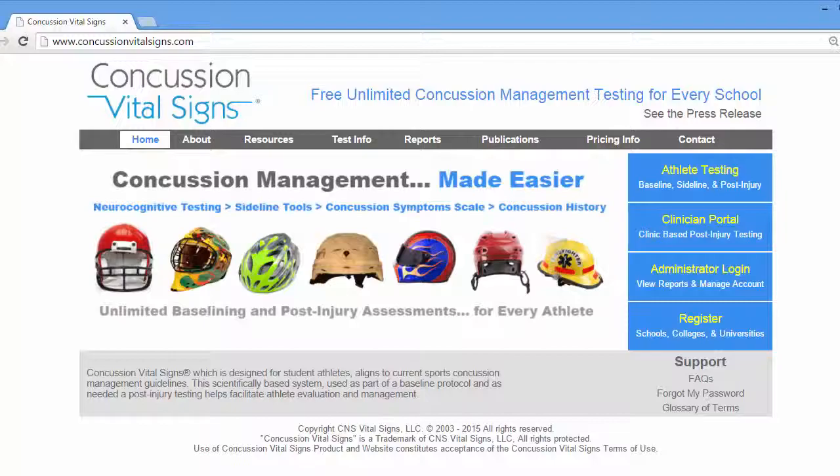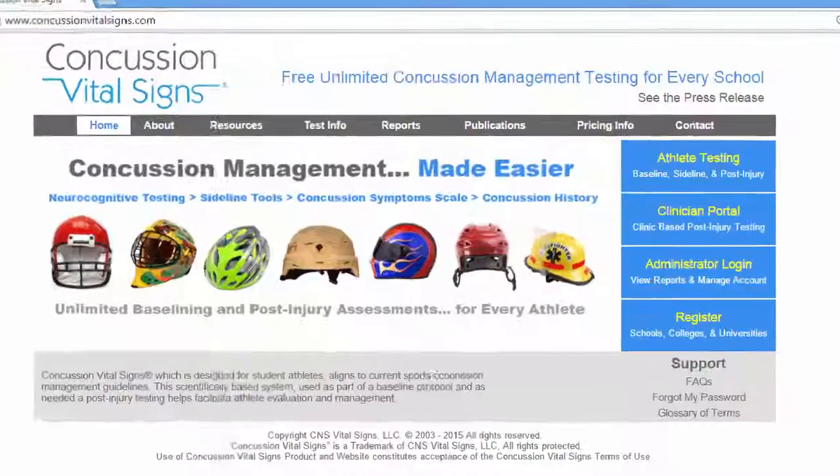Welcome to the Concussion Vital Signs tutorial on the Administrative Portal.